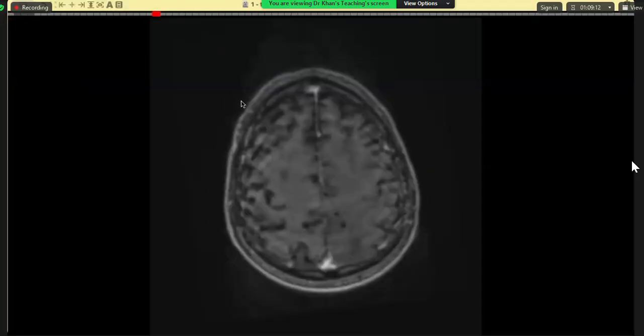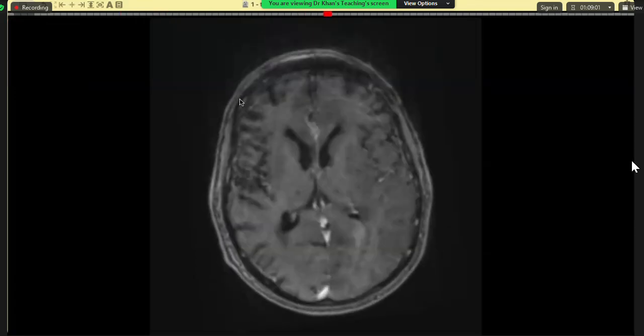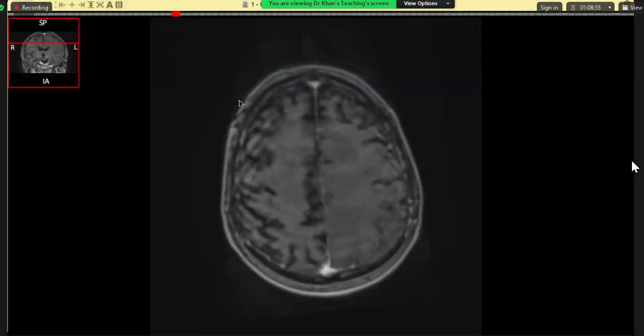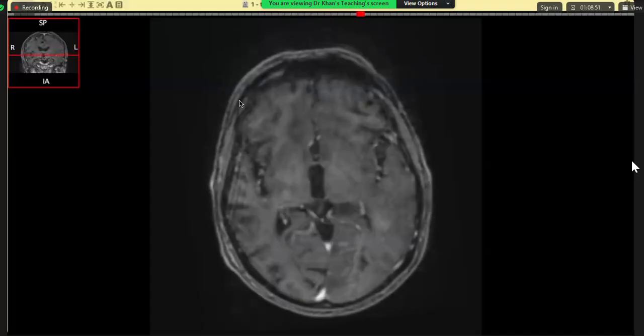No immune deficiency. Okay, so this is now multiple lesions scattered through the brain parenchyma with marginal enhancement. This could be multiple abscesses, but there is no significant edema surrounding. It could be white matter lesions, multiple white matter lesions. Just give me your conclusion and I'll then take over.